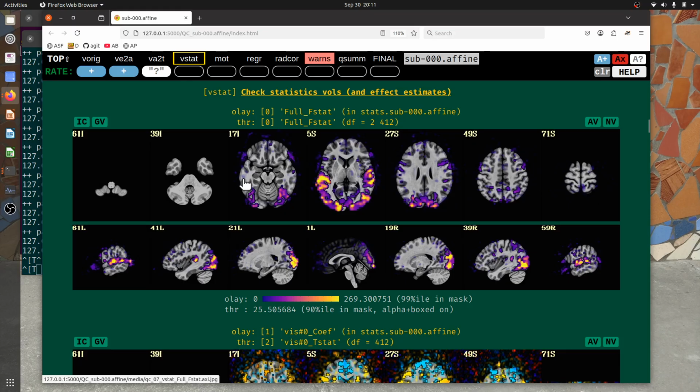But you can see there are little bits of faded purple around, because transparent thresholding is being used. The highlight, don't hide philosophy of displaying results. When things are sub-threshold, we will still see coloration there. It just fades increasingly below the threshold.